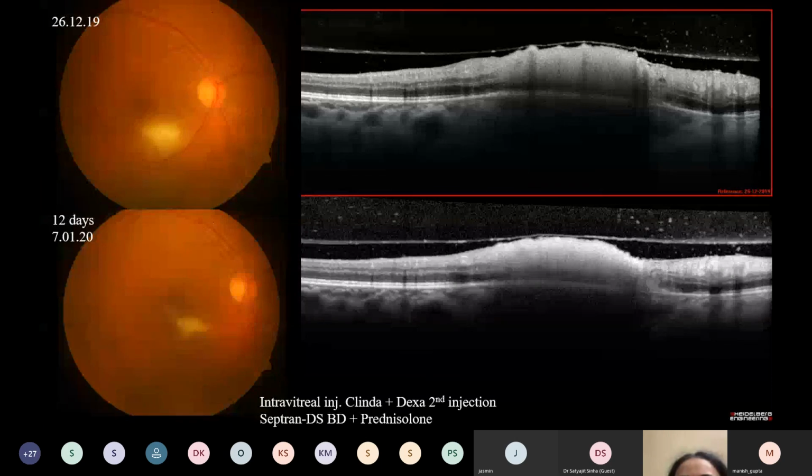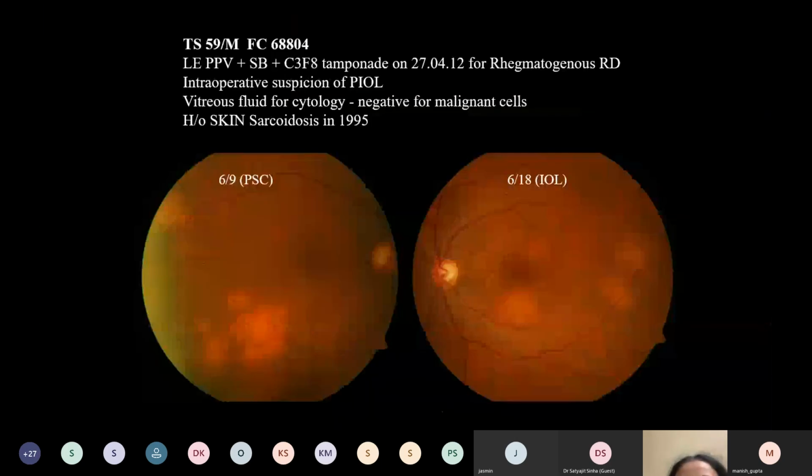So this is with the further treatment. These kinds of granulomas, when you see orangish granulomas, multiple, mostly in the posterior pole, they're different from what I showed you earlier from the TB granuloma. Here, the lesions are orangish in appearance. They don't have that yellowish appearance. They don't have exudative attachment around them. They're multiple, in contrast to the previous lesion, which was solitary. So these lesions are different from TB granulomas, and most likely these are the lesions of sarcoidosis.